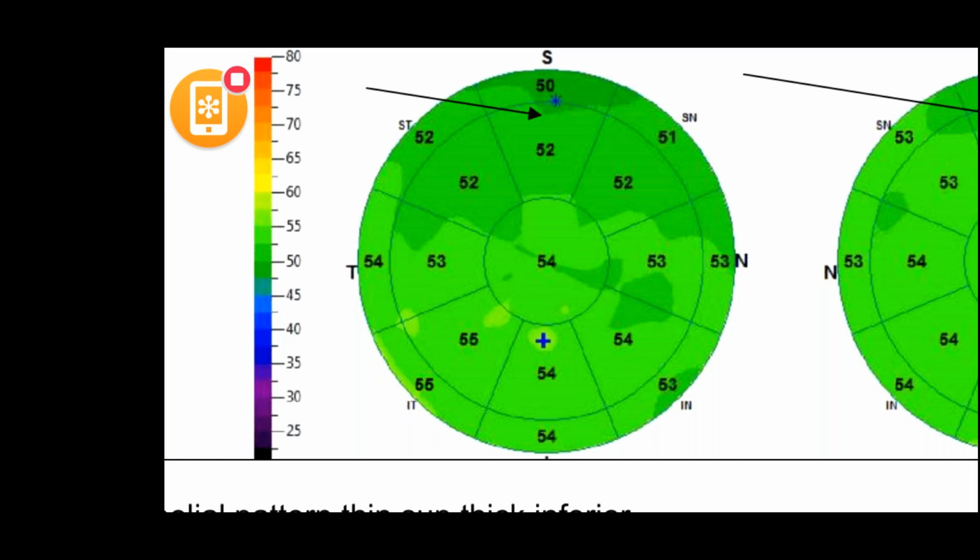If the pattern changes, the epithelium gives you a lot of information. The epithelium covers up a lot of things. It also tells you a lot of things. So the thinnest point of the epithelium is here, okay? And you see, this is the thick epithelium, and this is the thin epithelium. So this is a very normal pattern. You want thin epithelium on top, thick epithelium below.